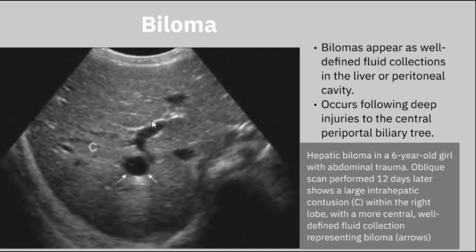Okay, now a biloma. Of course, when there's injury to the bile ducts, let's say the biliary tree, we could have a collection of hypoechoic area, and this was because of the contained bile within the liver tissue. Okay, it's a well-defined fluid collection.